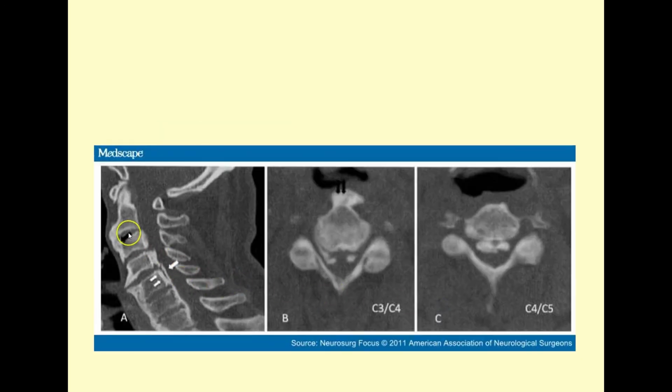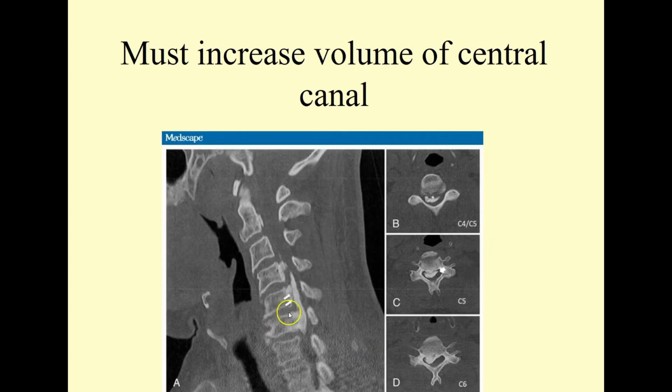Again, another CT study showing the combination of ALL thickening and PLL thickening, a cross-sectional CT, giving us some idea how much room it's actually taking up. Another larger example, a little ALL thickening, mostly PLL thickening, and again, you can see how much of the central canal is occupied by that enlarged and thickened ossified ligament.